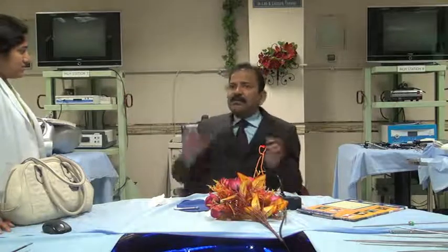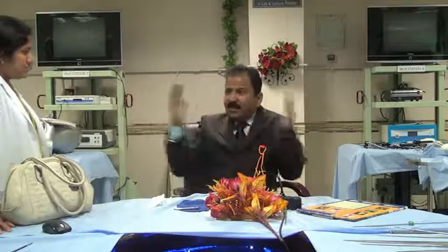Do you know why? Because for very good depth perception, it is important that you see without glasses. Once it comes towards you, it is converging and doesn't maintain the same width, because one glass is filtering x-axis light and the other glass is filtering y-axis light. That is the way it is, but a little benefit is there.